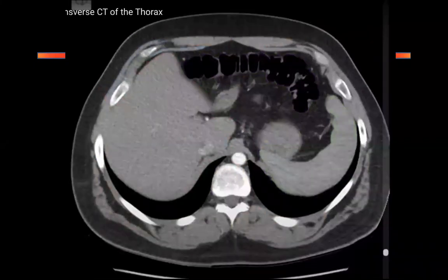Okay, look again at this. Forget this midline and everything. Identify the muscles for me. Everybody try to identify what are the muscles on the chest wall that you see. Spend a few seconds. Try to identify all the muscles that you can see in this picture: rectus abdominis, intercostal muscles, transversus thoracic.